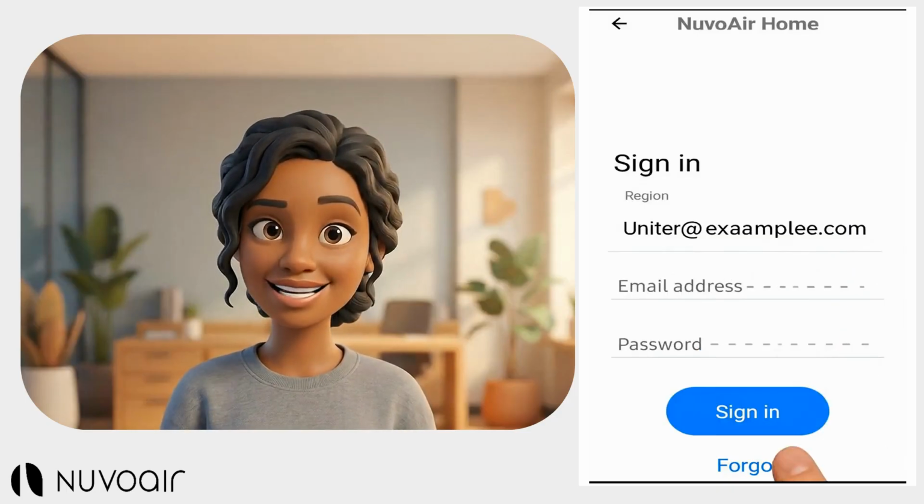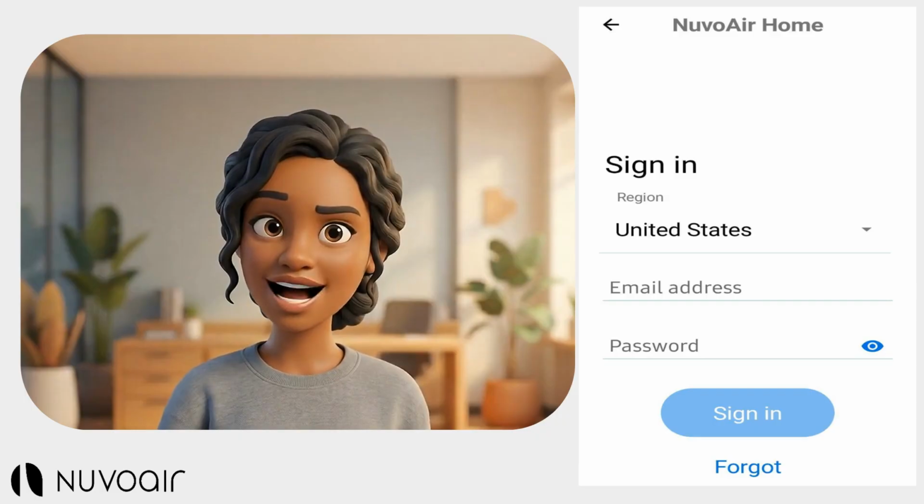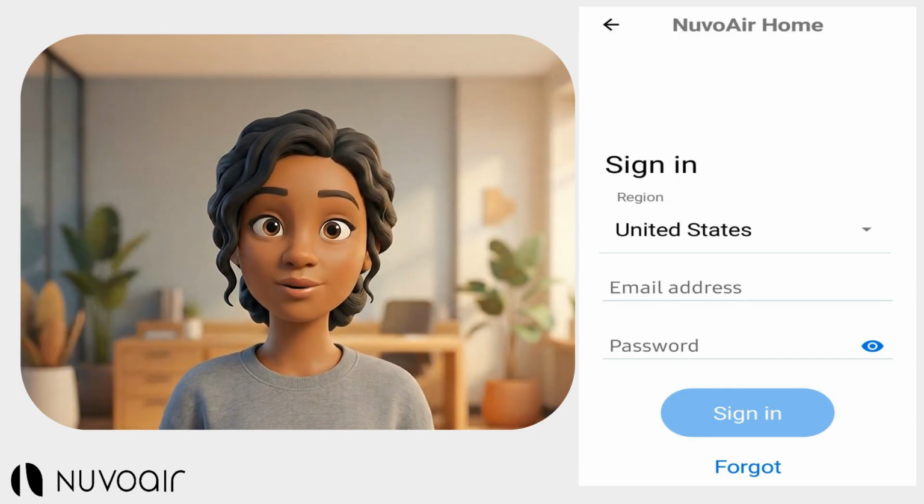Create a secure and case-sensitive password that you can remember. Want a helpful tip? I always write my password down and keep it in a secure place just in case I forget what it was. We all have a ton to remember these days, don't we?